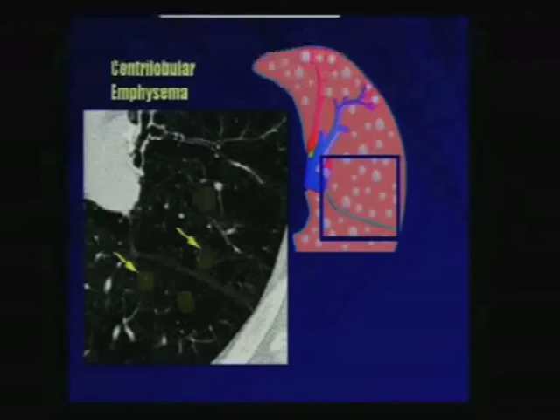And I think this is very important to recognize, especially in early centrilobular pulmonary emphysema. In patients with advanced pulmonary emphysema, you really cannot, as a clinician, do anything. This is advanced, it's already settled in, it's not reversible. But in early centrilobular pulmonary emphysema, this is a patient for whom you can tell them there is damage there, and then you can probably use it as a deterrent for them to stop smoking.